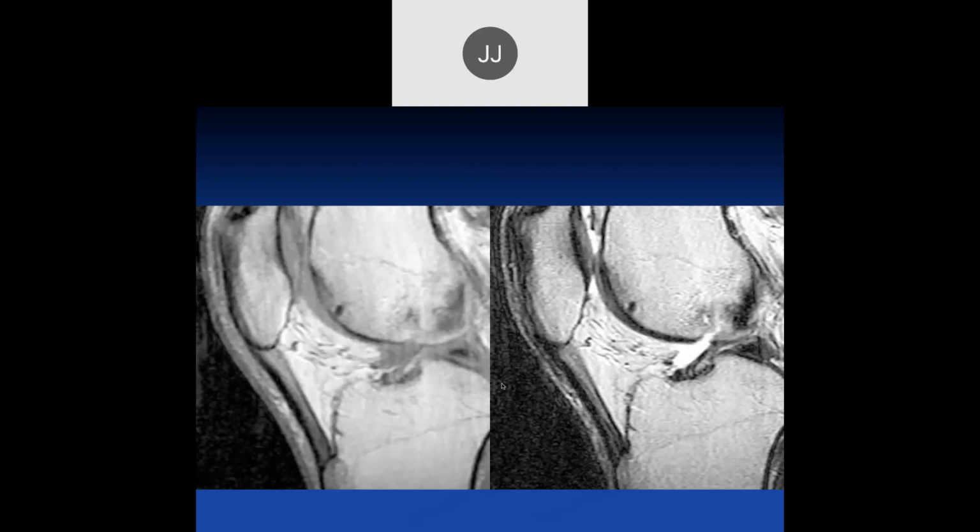Looking at the patellar tendon posteriorly, there's increased signal. It's pretty uniform. There's patella baja as well. Looks like a shortened patella. I wouldn't call this patella baja. If you look at the articular cartilage, remember that's really what's important. You're just having articulation between the inferior portion of the patellar articular cartilage and the superior part of the trochlea. So that's really kind of normal.